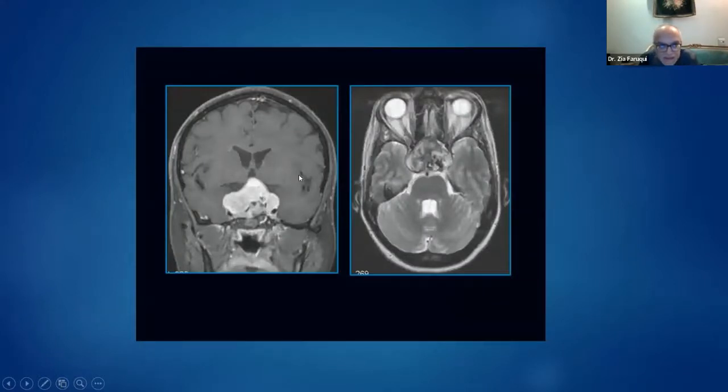In adults, these have a squamous papillary kind of tumor. So the pathology is different at the 2 age peaks. The reason for that, I don't know. But these tend to be more solid. They tend to be spherical in nature, and they will also have calcifications, but frequently not as many as you see in the pediatric variant. And again, calcifications will appear as low signal intensity on both T1 and T2 images.